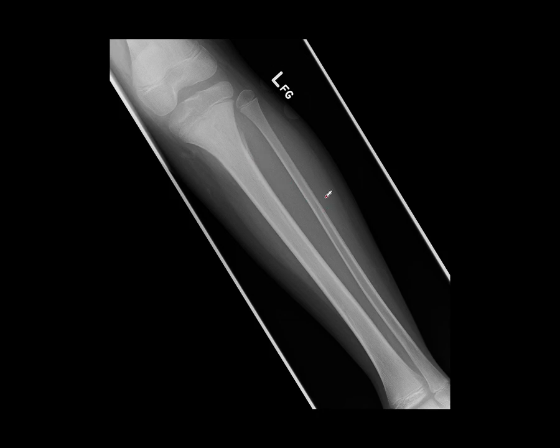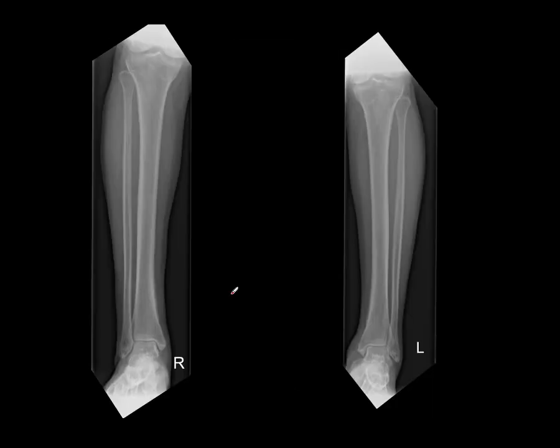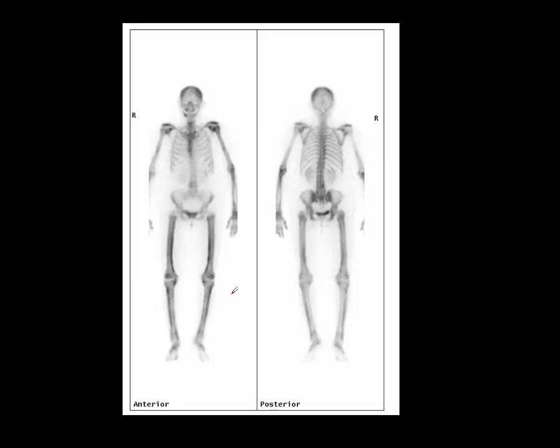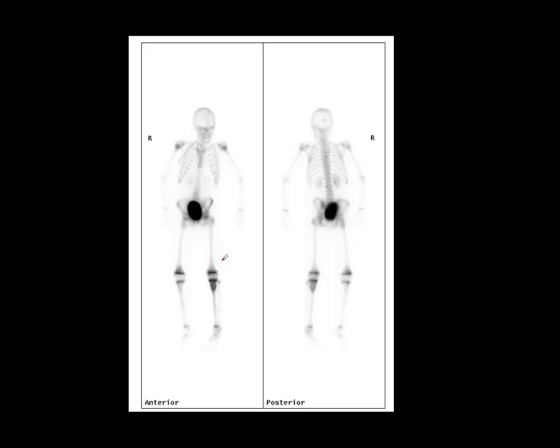And we'll just look at this patient's bone scintigram, just because it is a talk on bone scintigraphy. This was a Ewing sarcoma here. So, HPOA, hypertrophic pulmonary osteoarthropathy, diffuse peripheral uptake, like this. And the primary thing we're looking for is an underlying lung cancer. Of course, this is increased epiphyseal activity here, which we will see in younger patients.